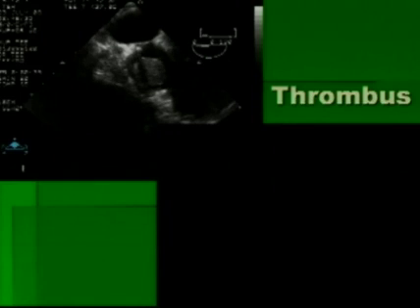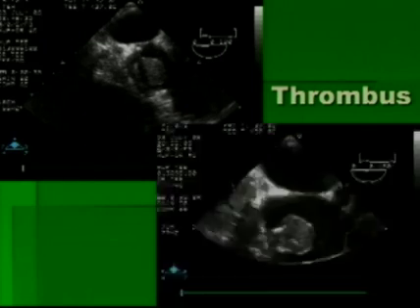This tumor, and again, we're going to have difficulty with one of these pictures, but it doesn't add a whole lot. This is a transesophageal echocardiogram. See the interatrial septum up here. So the mass is nowhere near that interatrial septum. It's actually down near the free wall of the right atrium. Tricuspid valve is down on the right-hand side of the screen. This, one would think, would be something consistent with a myxoma, but it turns out that this actually was a thrombus.